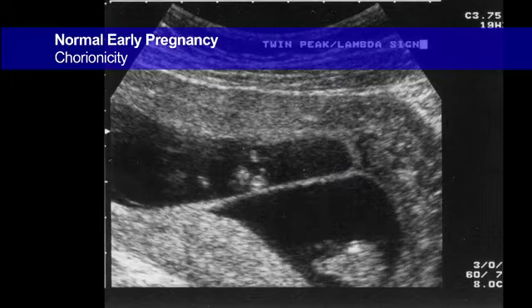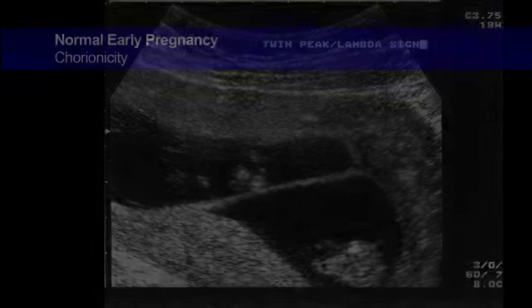In a dichorionic pregnancy, the membrane is characteristically thicker, classically described as being more than 2 millimeters in thickness, and coming out or evaginating from this triangular process. Seeing this twin peak sign is very diagnostic of dichorionic pregnancy. Its absence, however, does not exclude it.